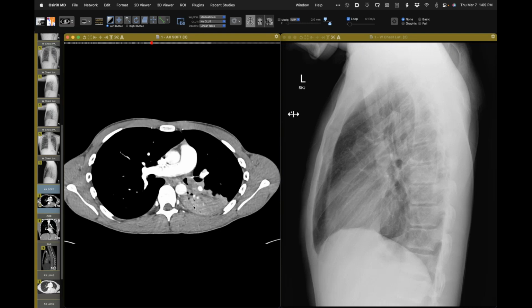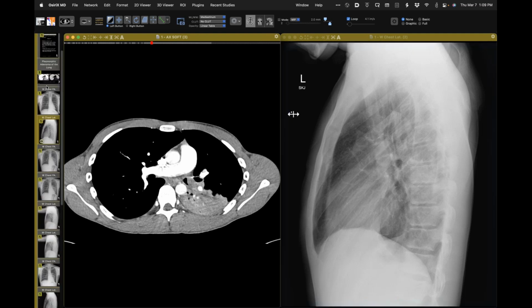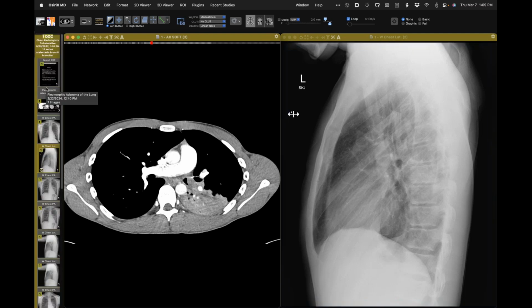So it's a matter of making that diagnosis and also diagnosing the presence of the lesion. Now, this hasn't changed over a period of years, and it's a young person. So that points towards a benign endobronchial lesion. And this one turns out to be a pleomorphic adenoma.